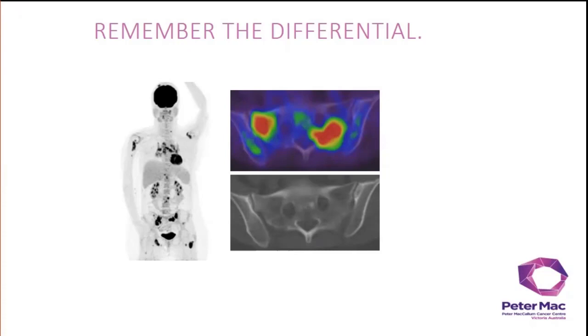She presented with pain in the left shoulder. MRI showed focal abnormality in the glenoid concerning for a metastasis. MDP bone scan showed focal osteoblastic activity in the position of the MRI findings, and the bone scan was otherwise unremarkable. This was acknowledged as a difficult site for biopsy.